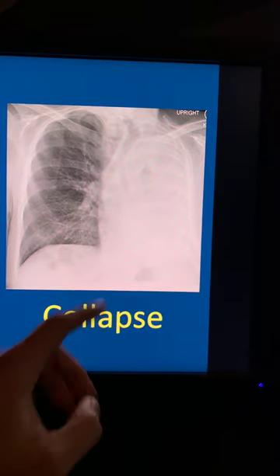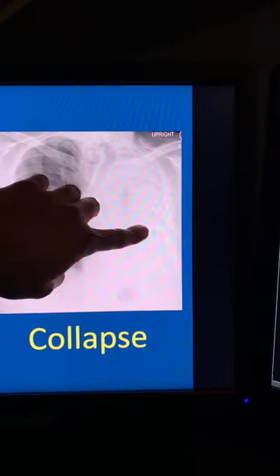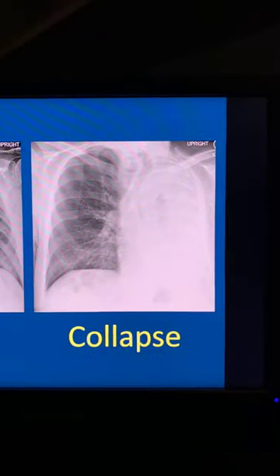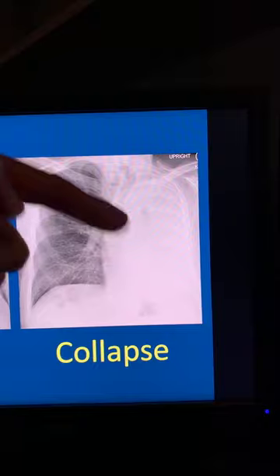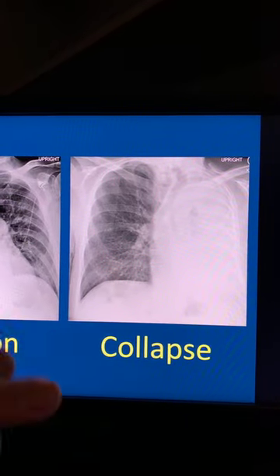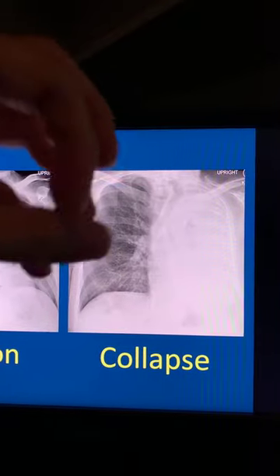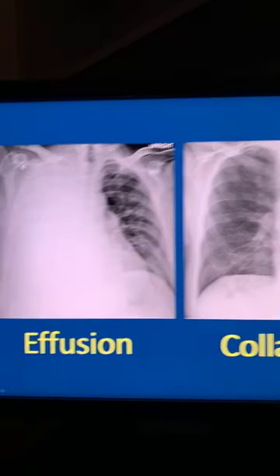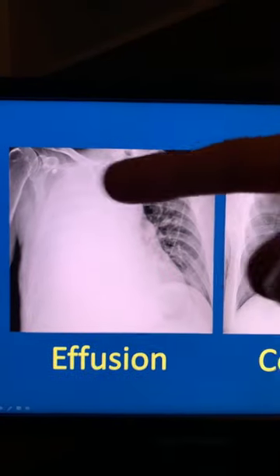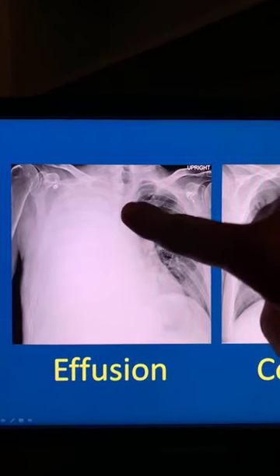Number three, look at the ribs. Look at the spacing of the ribs on this side and compare it to the spacing on the other side. Do you see how there's less spacing on this side than this side? Because again, everything is crunched down. Everything is sucked into like that little pocket of that negative vacuum. Now compare it to this side, all right? Trachea is not going that way, right? This guy is shifted, remember?